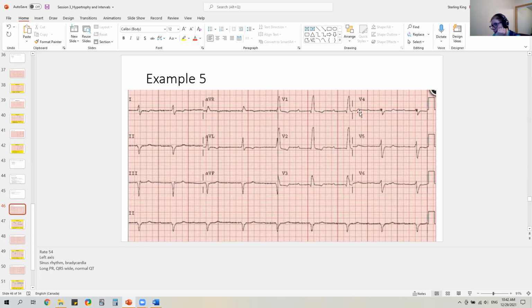Hypertrophies, so over here, it doesn't look like it's inverted, and it definitely doesn't look very pointy, maybe a little point, but definitely not high enough. It's so small, and there's nothing over here. Left ventricular hypertrophy, definitely not. That's not even close to big enough. Right ventricular hypertrophy, yeah, maybe. I'm thinking kind of a right bundle branch block right now, but maybe right ventricular hypertrophy.